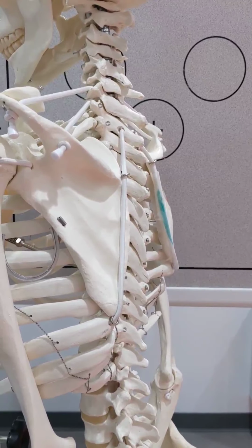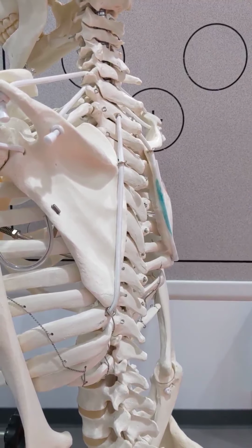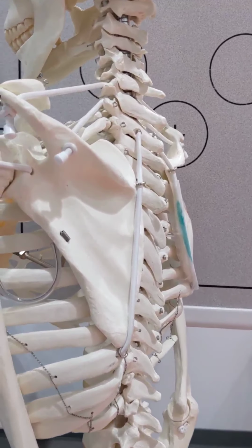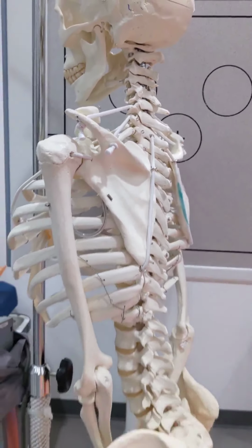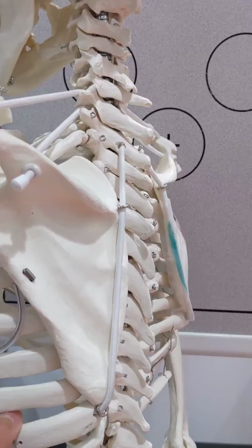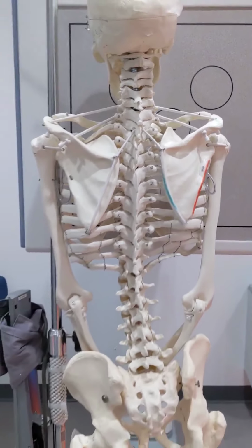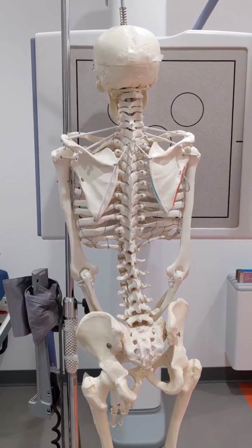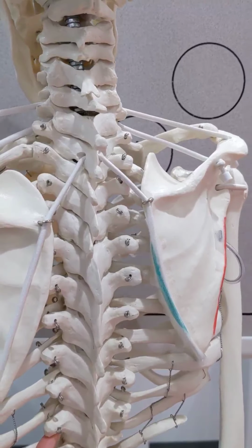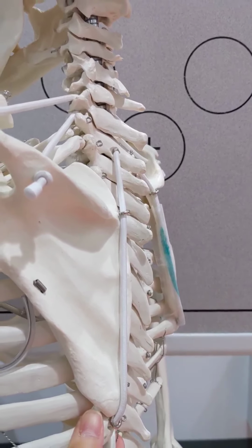So to achieve this, we had to oblique the patient. So then that's where some of our positioning errors can occur, is whether we oblique the patient too much or not enough. So if this is the optimal position, this RAO position, not enough rotation, because remember we started PA? This is our patient in the PA projection or position, and then we rotated the patient RAO until we saw the medial and lateral borders of the scapula superimposed.